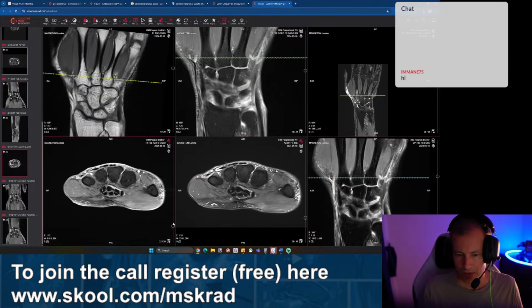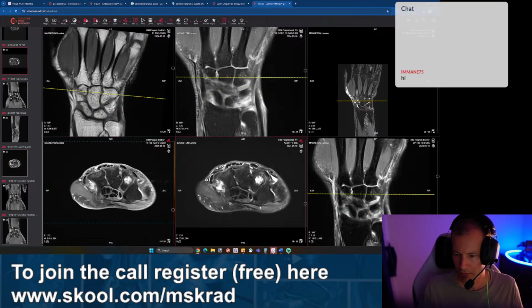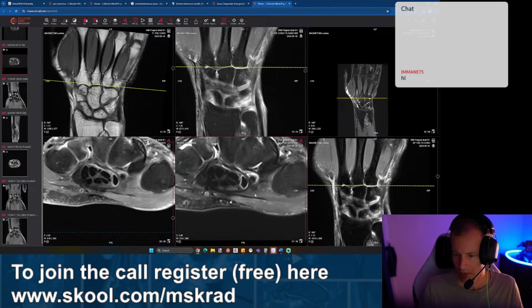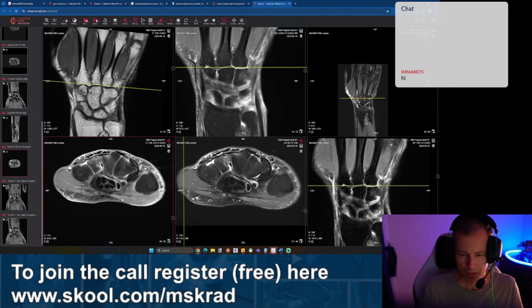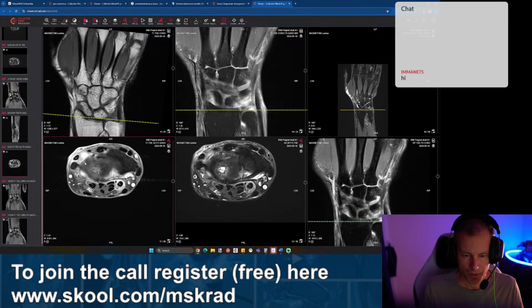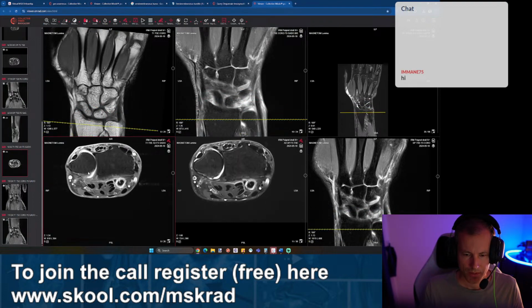And the other tendons, flexor carpi radialis, has a little bit of fluid here. This is less obvious. It's only one partial ring here. It's not very obvious, and I don't see, well, just on one image, a bit of very faint enhancement here. So a little bit of tenosynovitis there. We've got a bifid median nerve with a small persistent vessel here as just an anatomic variant. Then again, we see this in the post-contrast series, quite a lot of synovitis in these different joints.